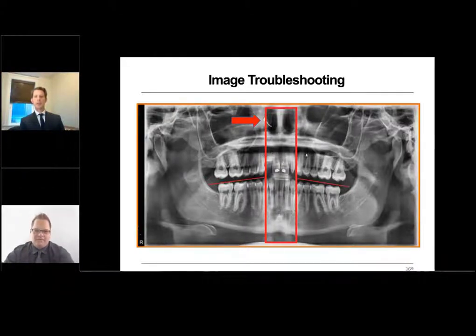I can't see them, I know, partially due to where the tongue was in the roof of the mouth, but it's pushed up and the hard palate's overlapping there. So if you bring the head down, it's going to have the hard palate move up and our anterior root tips move down to get that nice smile to be able to see the image there. Right. Yeah, I think that tipping that head down would have helped out of everything here, probably the most.